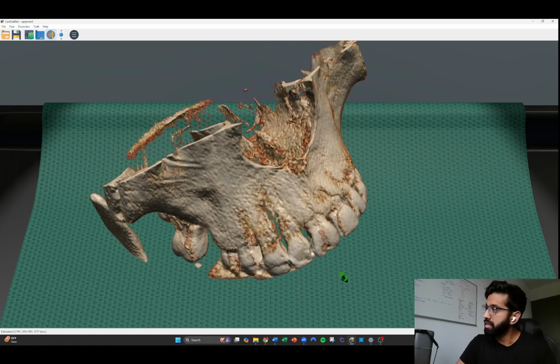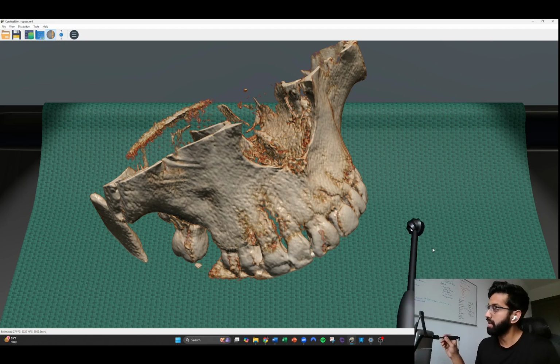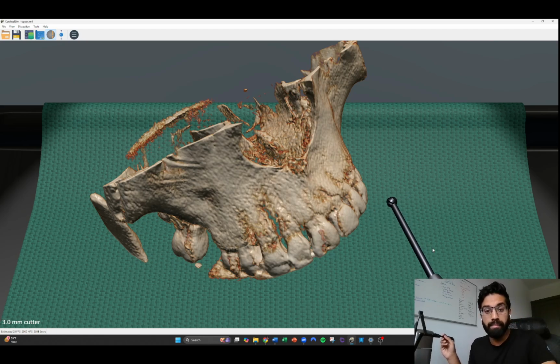But what we're actually going to do is allow the user, in this case myself, to start operating on this virtual patient and experience what it would be like to not just spatially go through this procedure and what happens where in the anatomy, but how the anatomy changes over time. And it's going to give our dentist or our oral surgeon a much deeper view into this patient's medical condition than they would otherwise. Keep in mind I'm not a dentist nor an oral surgeon, so I don't actually know what I'm doing medically.